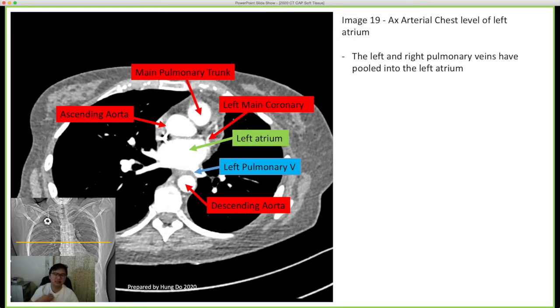sits in your chest, and then the actual port itself has an extension tubing that we have embedded inside the patient's skin. So this is a tunneled port, and the tunneled port gets then tunneled up into your neck and then threaded into your jugular vein. And the jugular vein obviously communicates directly with the SVC. So the SVC is where the port line is sitting.